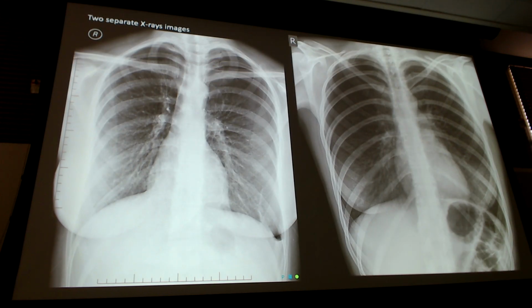All right. So let's go with the first image on the left. I'm just going to point it out. You tell me, in your own head, whether or not you saw it. We have a left-sided pneumothorax right here. I've got my visceral line in the shape of the thorax. I have absolutely no lung markings lateral to that line.